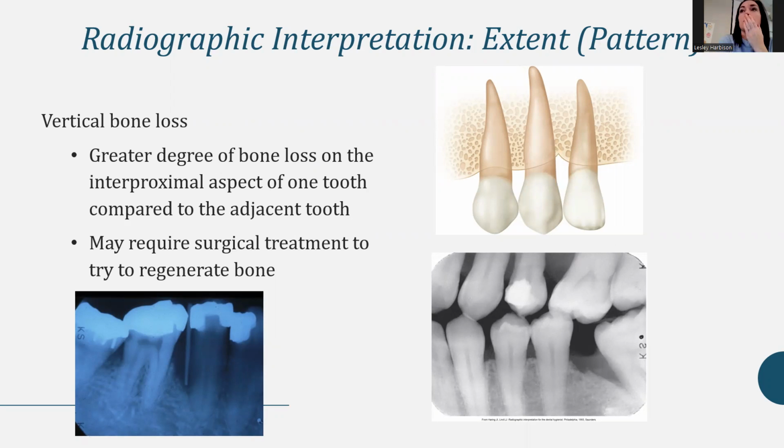I'm going to talk about vertical versus horizontal on the causes. Probably in Perio you will, like for bone grafting and things like that. I think she'll touch on that stuff in Perio. So there is localized like that and it's vertical, like when it's all together, it'll be vertical.